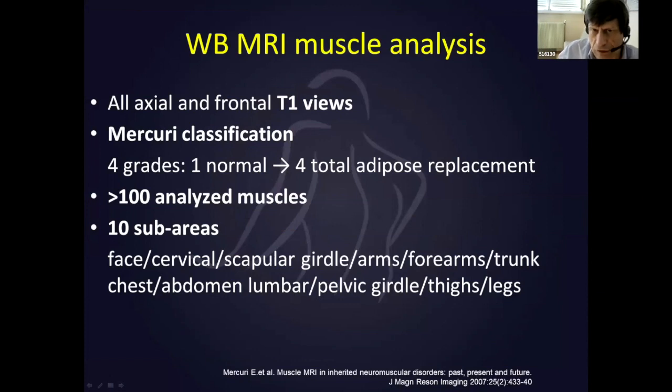After the technical description, the radiologist has to perform the analysis of the examination. We examine all axial and frontal T1 weighted views. We perform Mercuri classification.